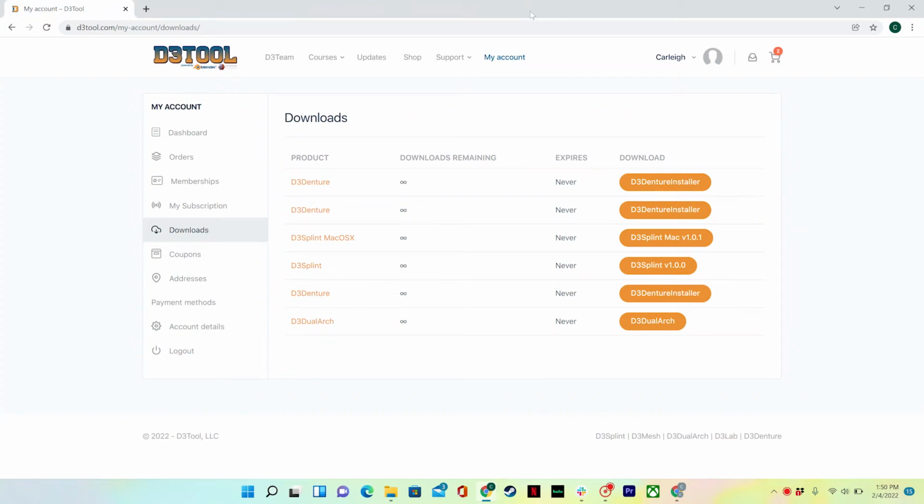Just wanted to make a quick video going over how to download and install D3Splint version 1.0.0 and all future iterations. So after you purchase the software, you should get a purchase link in your email, but you can also reach all of your downloads by logging into your D3Tool.com account, going to your My Accounts page, and then over here in the My Account menu, if you go to Downloads, there should be a complete list of all of your downloads.